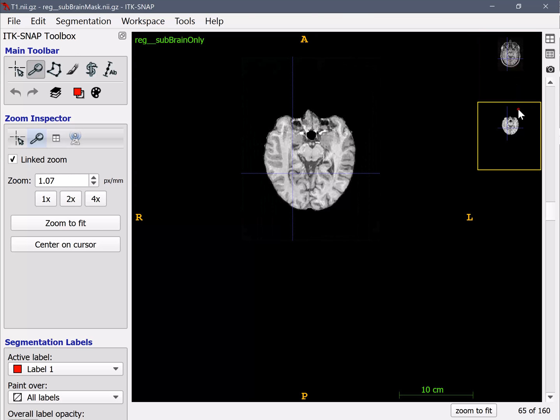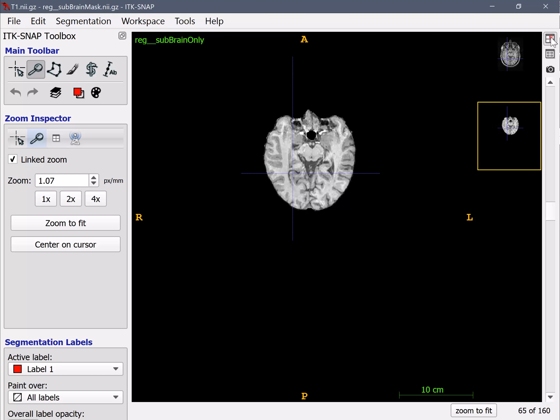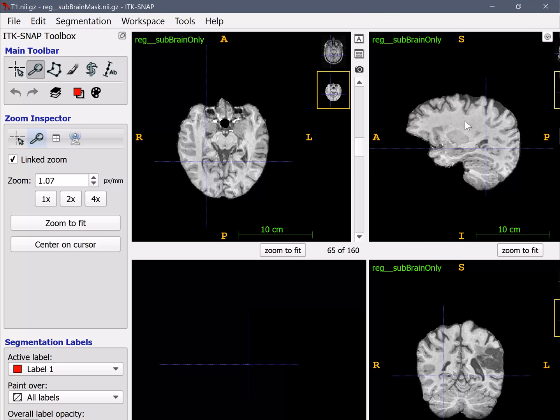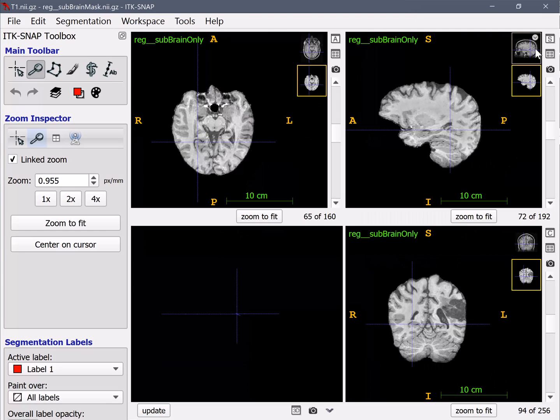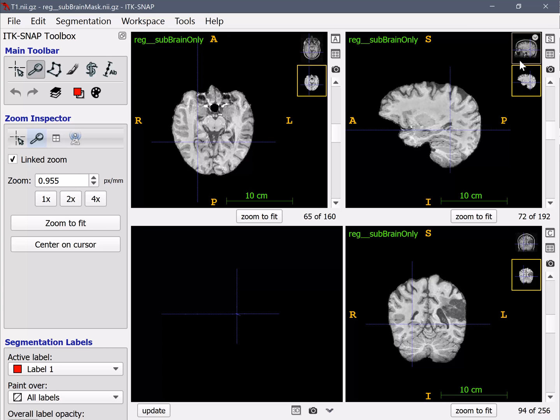What you'd see, one of the differences is that we apply a bit of denoising here and everywhere in the image. It's a denoising that preserves actually the anatomical features, the gray matter, white matter, density and contrast, but it removes the noise that is in one of these. And one example could be seen here easily in the white matter. You could notice a little bit that this image, the native one, is a little noisier than the processed one.